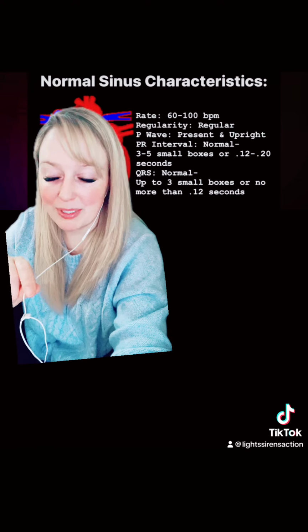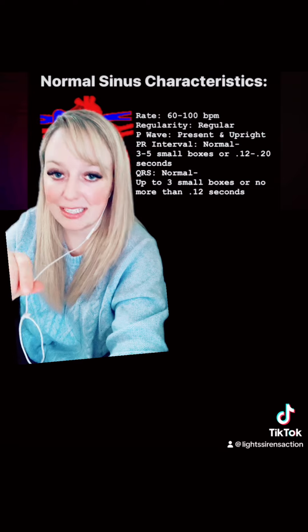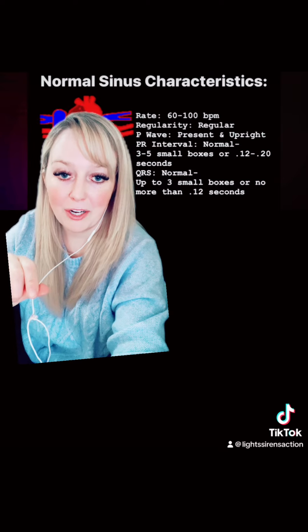First of all, we always want to look at the rate, right? Is it between 60 and 100? Because we know that that is a normal heart rate. Can it come from the SA node if it's above 100 or below 60? Yes, that is where you get terms like sinus bradycardia or sinus tachycardia.